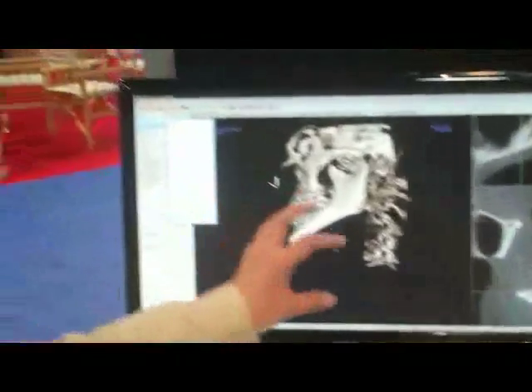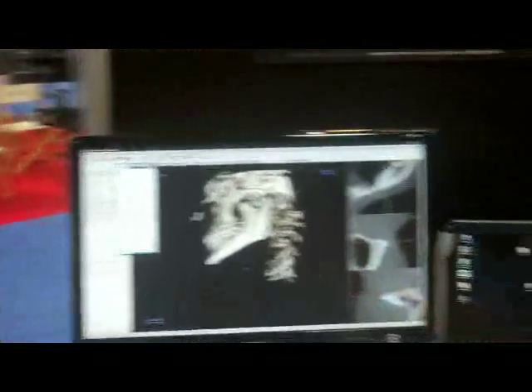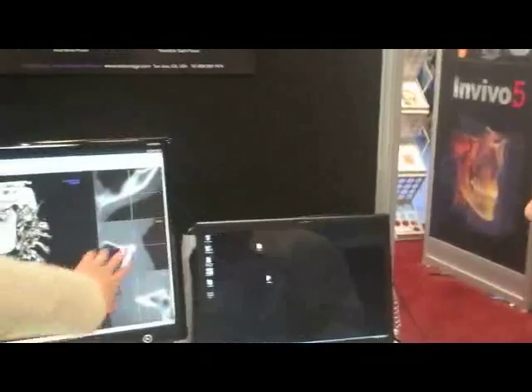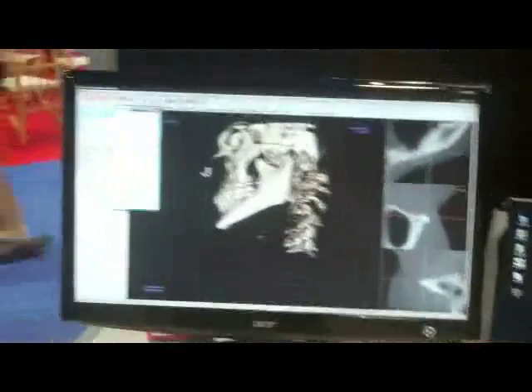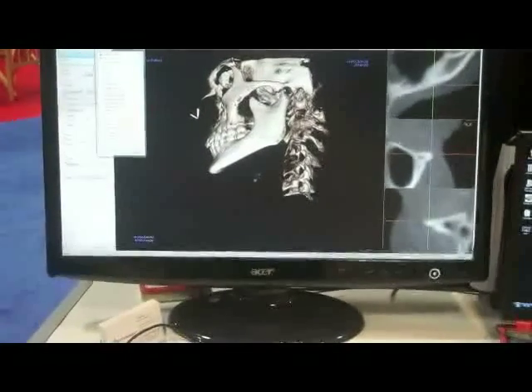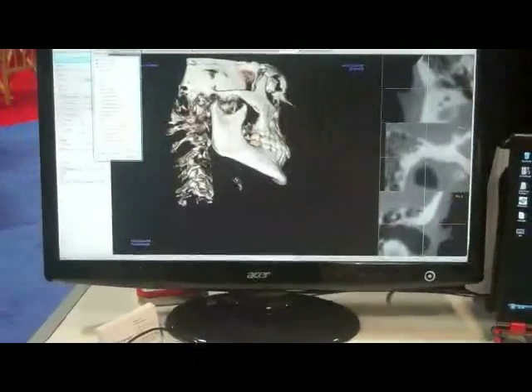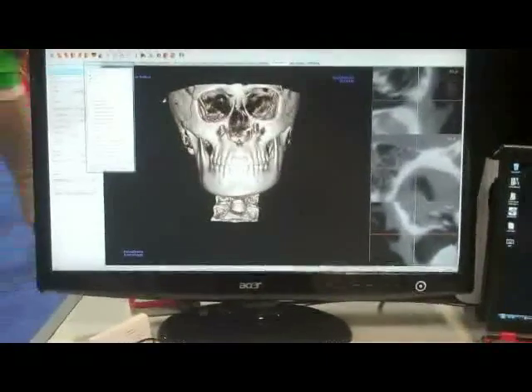So if you want to change it, how do you do this? You have to actually go back and redo that one. Redo? You cannot just line up here? Not yet. Not yet? Right, exactly. So then from here we could say, all right, Porion left. Place that on Porion left. Porion right. Place that right on Porion right. And then Nasion.